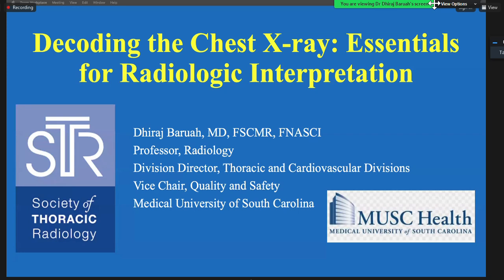Most of you probably know most of the stuff that I am going to highlight today. But again, it is very important to go back to the basics. And so my topic for today's presentation will be decoding the chest X-ray, essentials for radiologic interpretation.